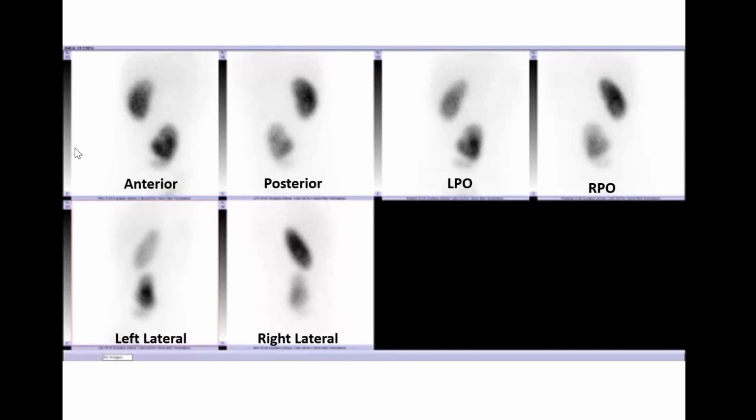Right, sir. So I'm presented with multiple images taken from the DMSA scan of a 1-month-old child. In these images, I can see normal uptake in the right kidney. However, the left kidney is not seen in the left renal fossa. In fact, an area of increased uptake conforming to the shape of the kidney is noted in the left pelvis.